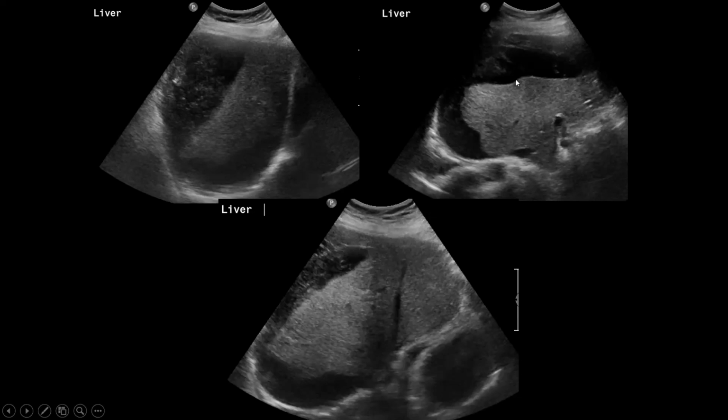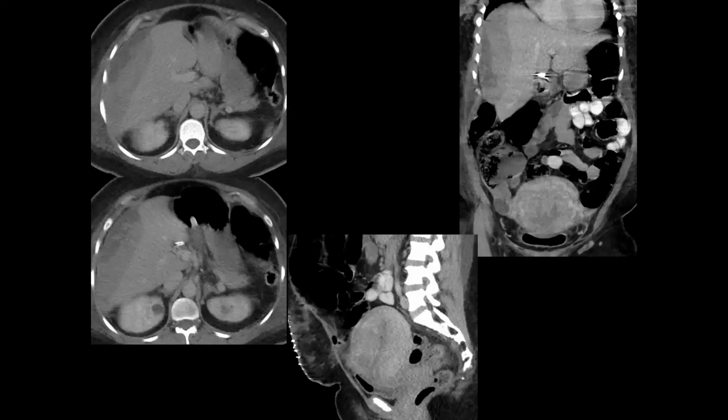So in a patient with preeclampsia, sometimes they can have thrombocytopenia and they are prone to bleeding, which is known as HELLP syndrome. High liver enzymes, low platelets in patients with preeclampsia. This is a CT scan showing this collection, which is high density. This turned out to be subcapsular hematoma, and you can see the signs of recent cesarean section. Here's a sagittal image of the pelvis. You can see the uterus is still bulky, and the surgical clips can be seen in the anterior abdominal wall due to recent cesarean section.